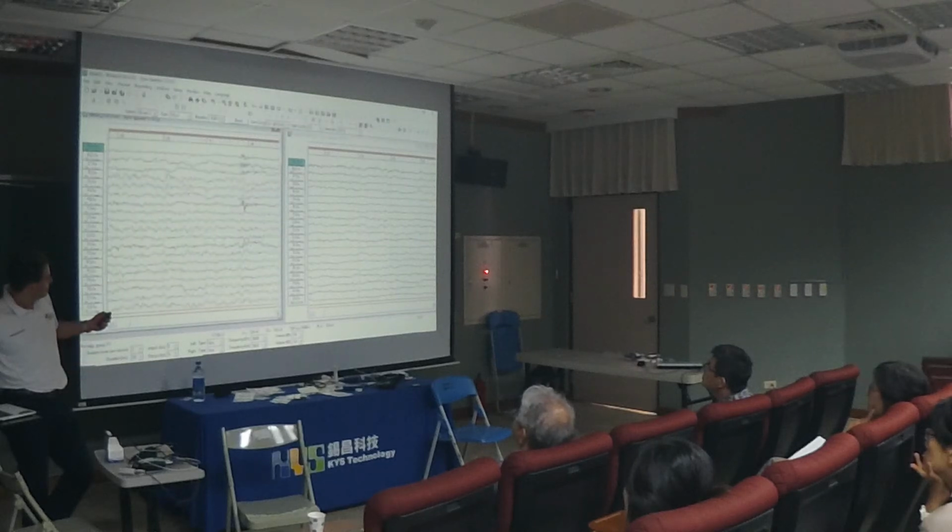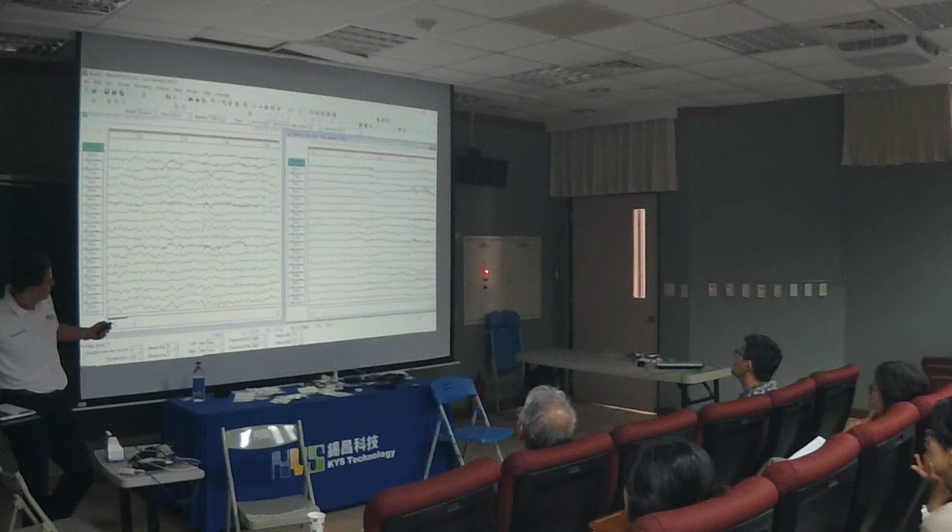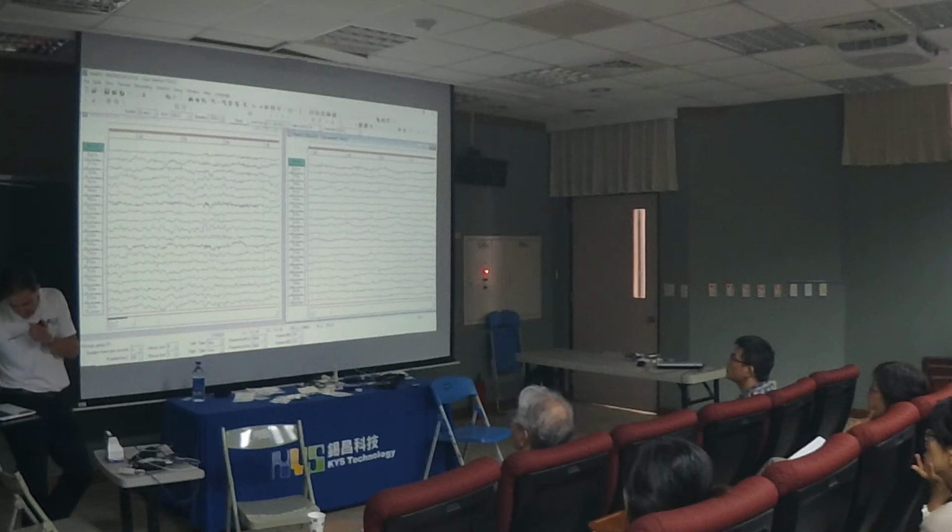Watch all the slow brain wave activity. See that right there? Look at that. Do you see it? And this is 20 sessions later. You see the difference? That's movement. But can you notice the difference? Look at that. See that? So what we did was suppress the activity. Look how different the EEG looks.